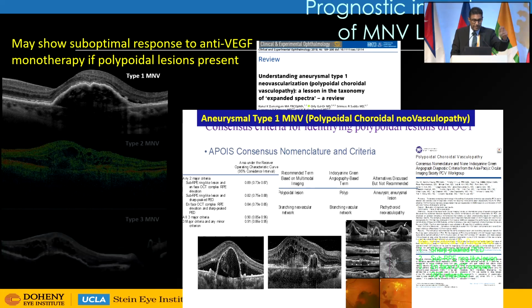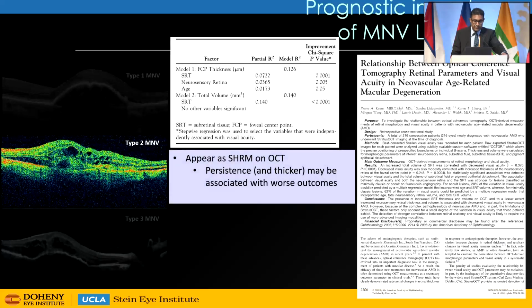And I suspect Dr. Vorporn is going to get into more detail on this, but of course we have some clues now of being able to recognize PCV on OCT that have been described by a few different groups now.